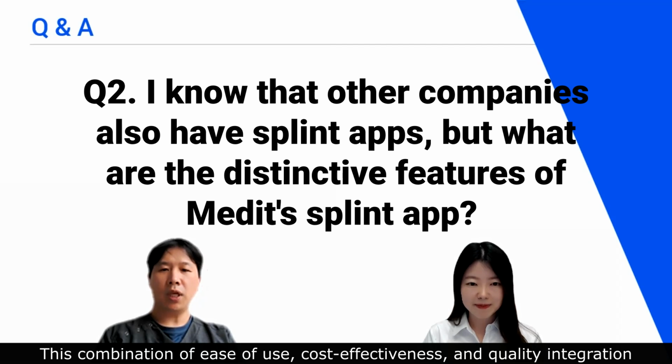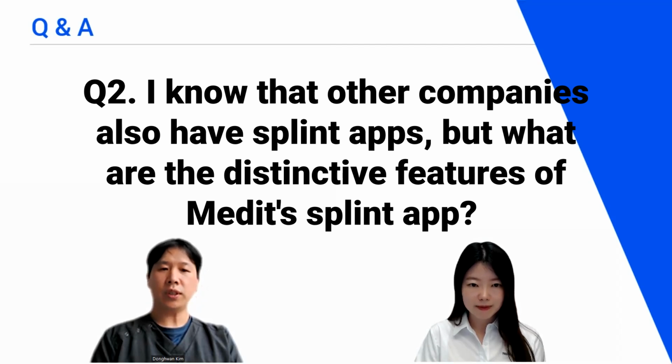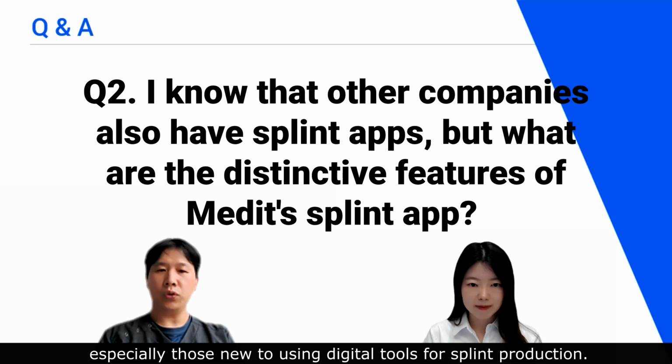This combination of ease of use, cost effectiveness, and quality integration makes the Medit Splint app an attractive option among dental professionals, especially those new to using digital tools for splint production.